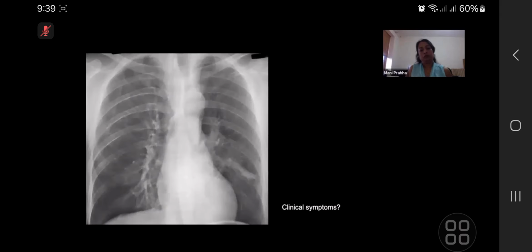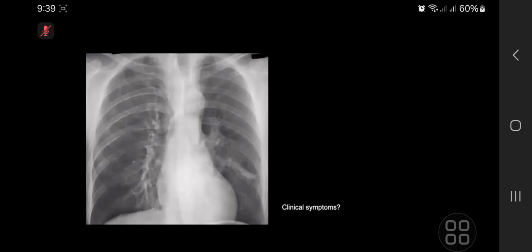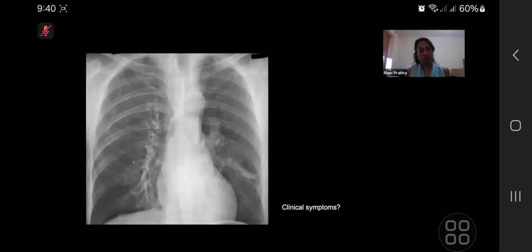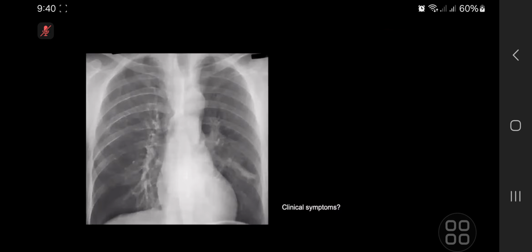Next one. Frontal radiograph, this seems like a slightly older child. In terms of situs, levocardia, the aorta is left-sided. The contour of the left mediastinum is also abnormal. It has a sort of three-shaped configuration. The pulmonary arteries are within normal limits. There's no cardiomegaly.